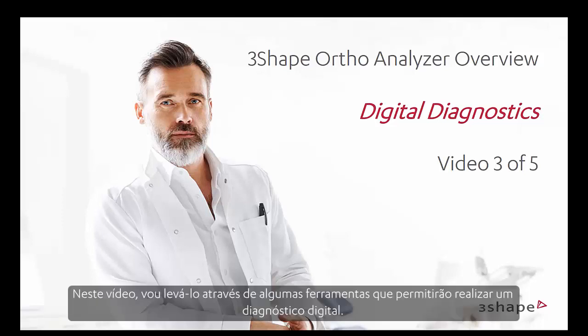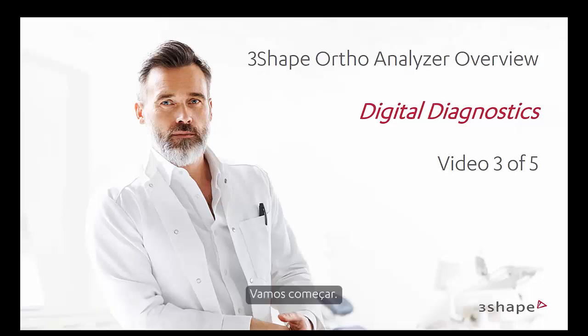In this video, I'll take you through a few of the tools that will allow you to do digital diagnostics. I do not have time to cover them all, and the ones that I do cover, I will do so fairly quickly. Let's get started.